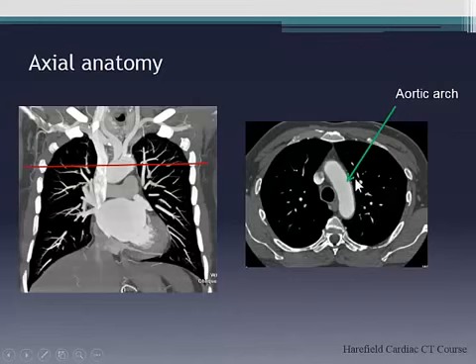If you do see a vessel there, it's going to be one of potentially three things, usually two things. Sometimes it can be a pulmonary vein in a bit of an odd position, but that's unlikely. So the two commonest things are going to be a persistent left-sided SVC, or no, azygos is going to be on this side. So it's going to be anomalous venous drainage of the left upper lobe. Okay, so that's the classic. The way to distinguish those two on imaging is you can follow it up and down because you've got a volume of data, and you can see if there's an absent pulmonary vein and you see the pulmonary vein draining into the brachiocephalic and the brachiocephalic coming across, then it's anomalous venous drainage.